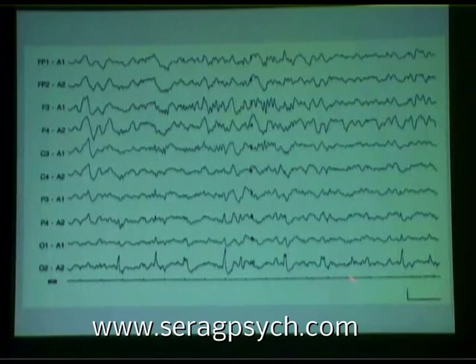More than just a decrease in the sleep spindles, you notice these spikes here at O2. And notice also that, as opposed to that boy I showed you yesterday that was kicking, every time you see a spike here, you see a little bit of involvement in the parietal lobe. See that? Each time, and also on the left occipital lobe as well. So this is the behavior of right occipital spikes.